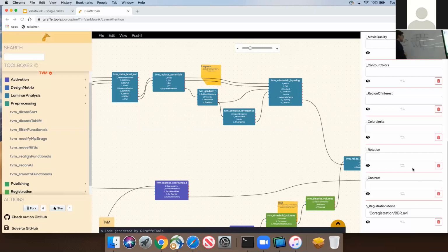We could say, well, this voxel here, Cheryl, do you have different colors for me? I do. There's a bunch of colors in the drawer right in front of you, so if you don't like any color. Right, and there's more down here.